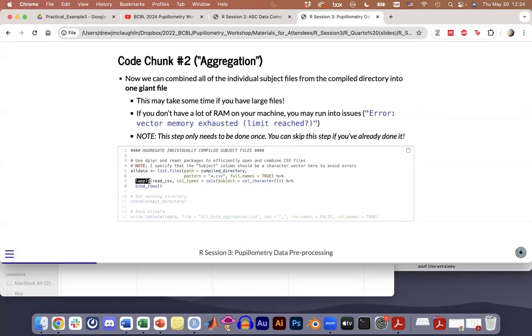So again, remember when we're thinking about list notation, data frames are like Excel documents. They're nice and pretty and really conceptually easy to think about. If we have a list of a bunch of Excel documents, sort of imagine it multi-dimensional now, it's like all of our Excel documents are lined up. This time, each of those Excel documents corresponds to a single participant. We're opening all of them at once, and it's automatically making a list in this step of this long pipe.